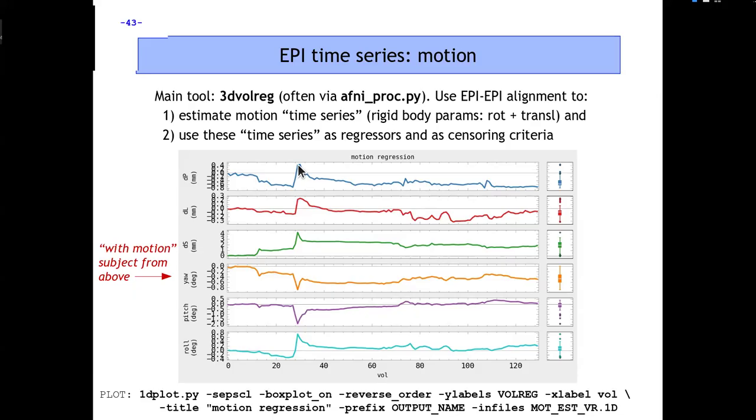So actually, from here to here, there's very little change in DP. That means the person at time point, let's say 30, 31, and 32, had their head in the same position. It was equally the same from the reference point, but they weren't really moving it at this point. Then they started moving, and now they were pretty constant in this posterior anterior axis.